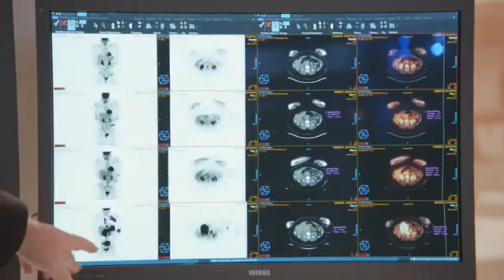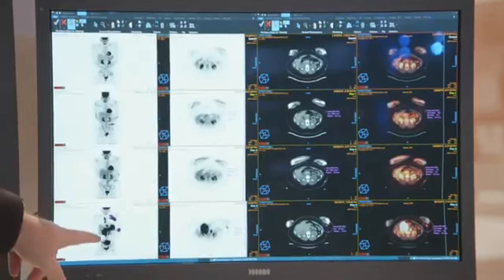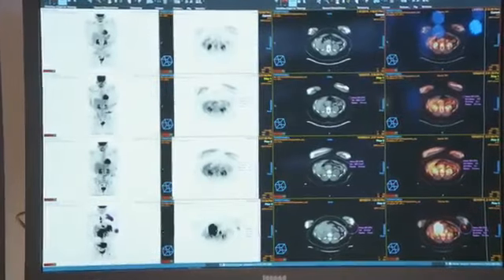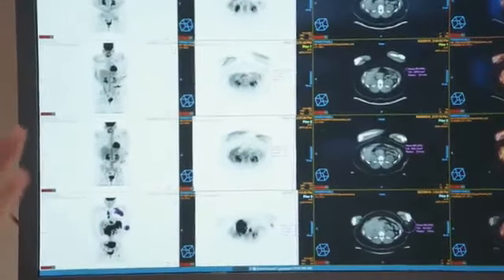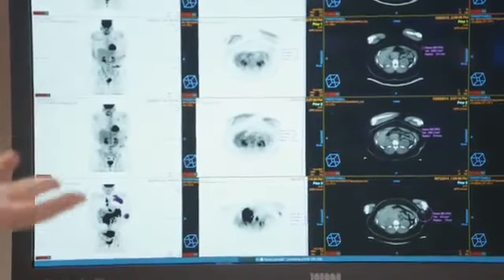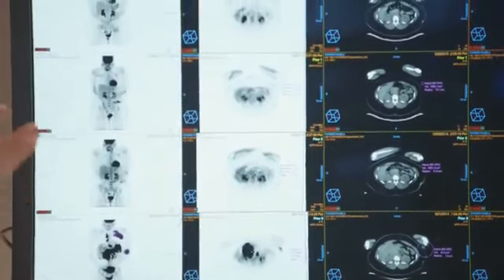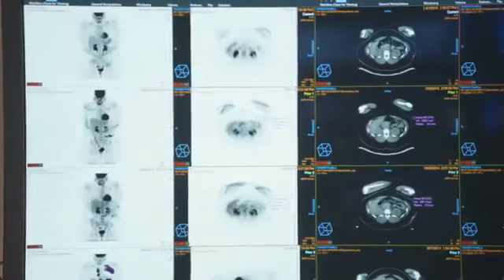And as you can see over the MIP images, the lymphoma is pretty dark there. And most of the times when we're talking about oncology, we'd like to use lesion management tools. Lesion management tools actually work okay for CT and for MR, but we added a new tool to handle PET and SPECT images as well.